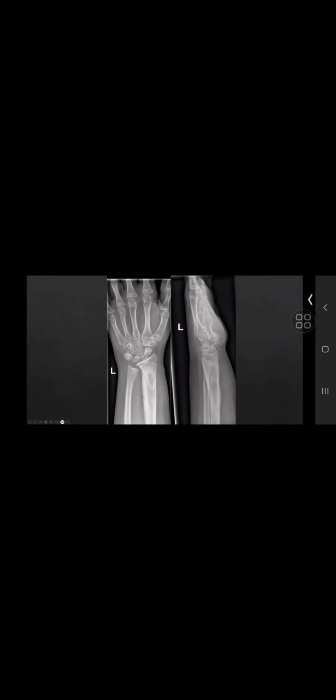But now he came back with some pain and swelling, and there was a new lucency that developed. MRI was done, and that showed some enhancement in the periphery and a non-enhancing area in the middle. And then they went in, aspirated that, and found out it was infection and abscess that had developed in the previous fracture site. But not always.